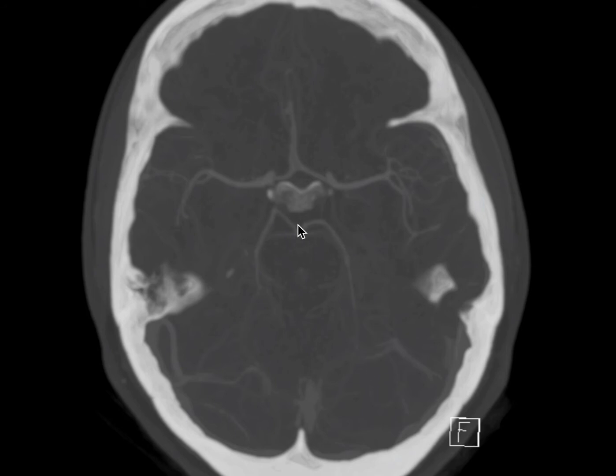First, the P1 segments. These will extend from the basilar tip to the level of the posterior communicating arteries. In about 25% of angiograms, one or both of these will be absent or hypoplastic, and instead there is a large caliber posterior communicating artery allowing blood from the anterior circulation to help supply the posterior brain. Next, we have the P2 segments.